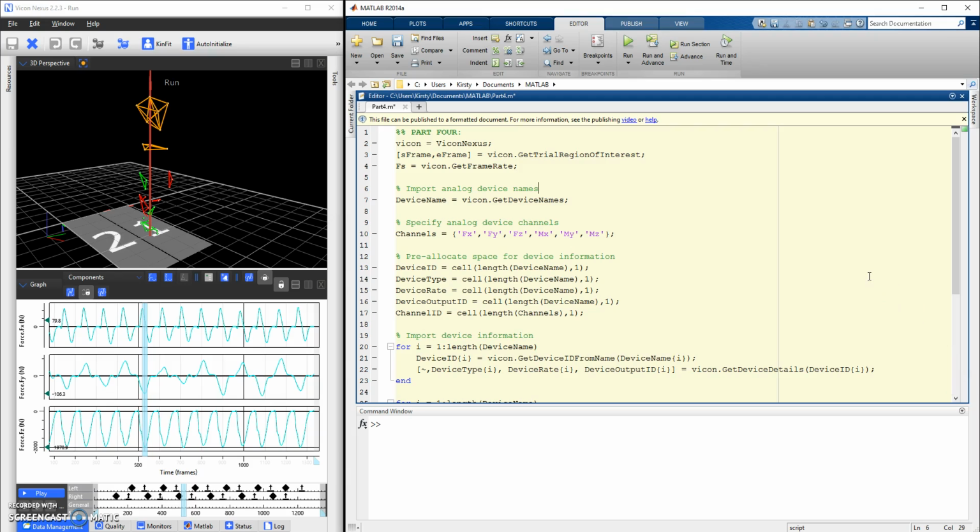So, this is a pretty challenging area to automate. I find it requires lots of input. So if you know the inputs and you have worked out what they are, you could write it simply with the known inputs. But I'm trying to create a script that's good and flexible for automation.